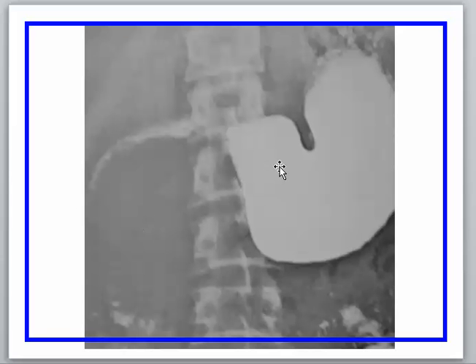Here we find the reverse, that the duodenal loop itself is markedly widened, and again we can say ironing of the mucosa of the pylorus, ironing of the mucosa of the duodenum. Ironing means stretch. It could be due to, of course, first possibility pancreatic mass, second possibility pancreatic pseudocyst, and third possibility we can put all what can happen here at the region of the retroperitoneum. Retroperitoneum is showing either an aorta with an aortic aneurysm, or pancreas with pancreatic mass or pseudocyst, or lymph nodes. We can get the retroperitoneal lymph nodes.